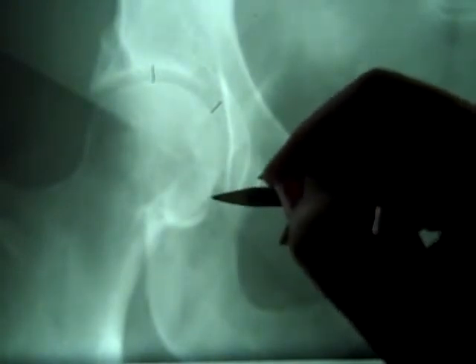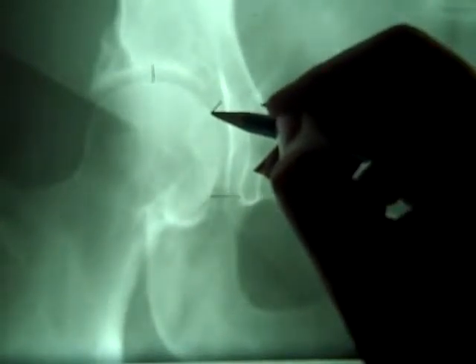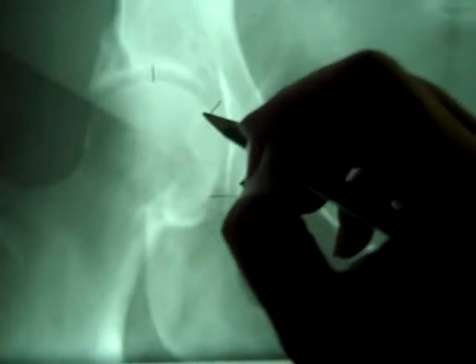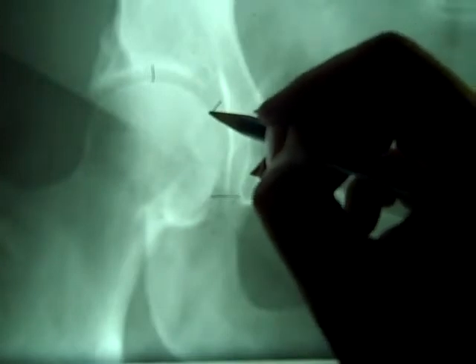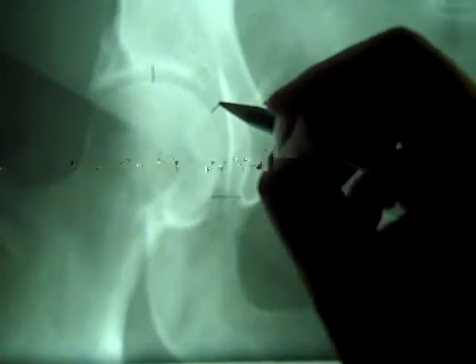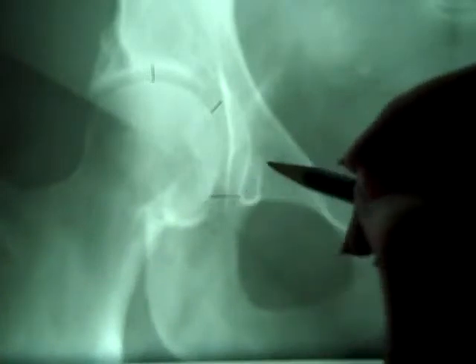Now, for the normal ranges, just like we said before, 6 to 11 for teardrop, that's still the number, but there's another comparison that's going on here. For superior, superior usually measures around 4 millimeters. Axial also usually measures 4 millimeters, and you're measuring at a diagonal or at a 45-degree angle across your film, again from femur head to acetabular ridge. And then, of course, medial is femur head to Kohler's teardrop.